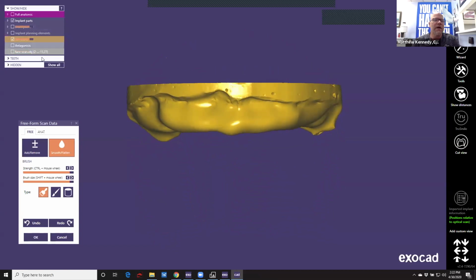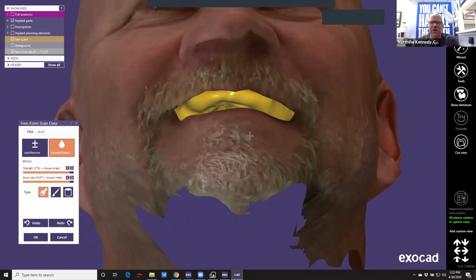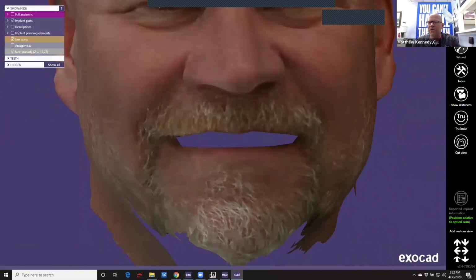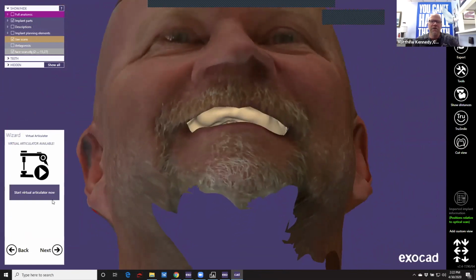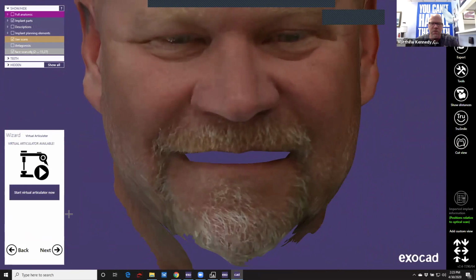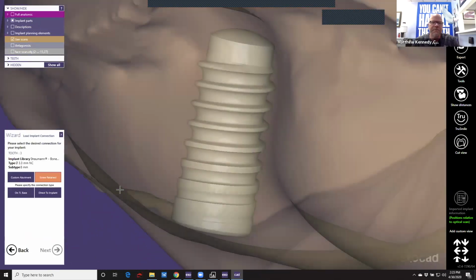Okay, so now we have face scan, no transition line showing, tissues in place. We're going to say, okay, I'm going to go back to wizard mode. Virtual articulation, we're not going to be going over that today. It's a very easy process. We're just going to skip that and go to a basic arrangement.